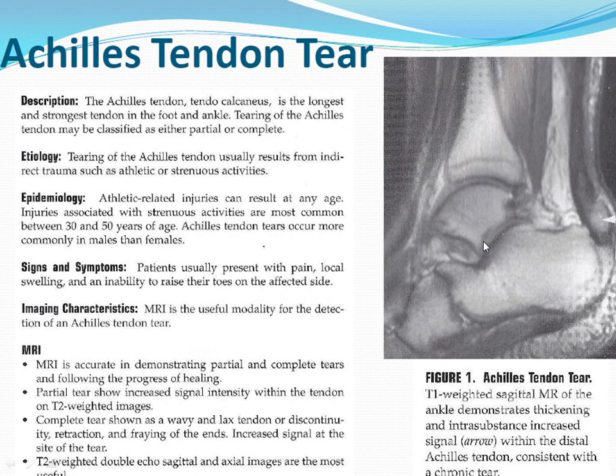So MRI is going to be really useful for evaluating, obviously, like with most things, the extent of the tear and whether it's something that's going to need surgery or just immobilization in a walking boot or cast.